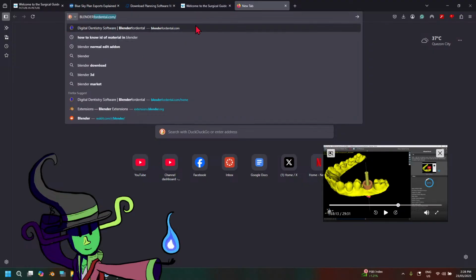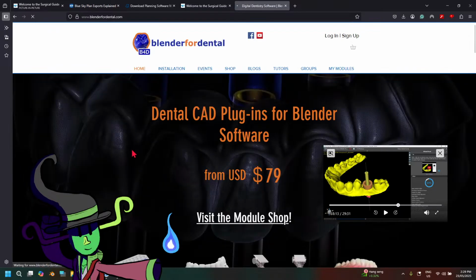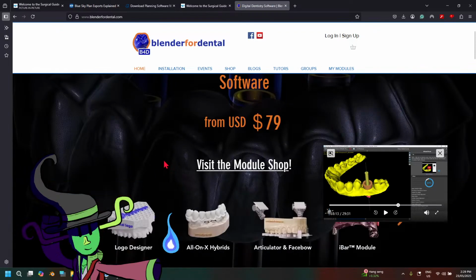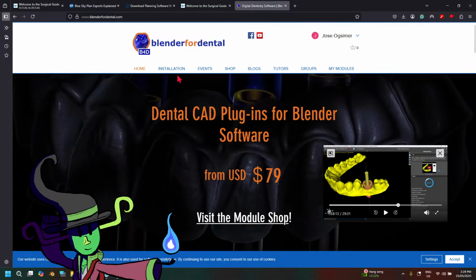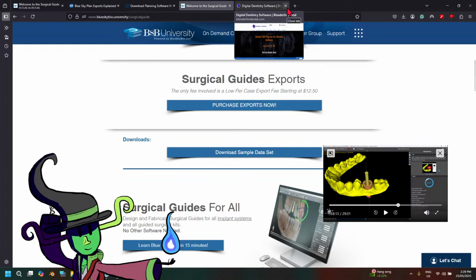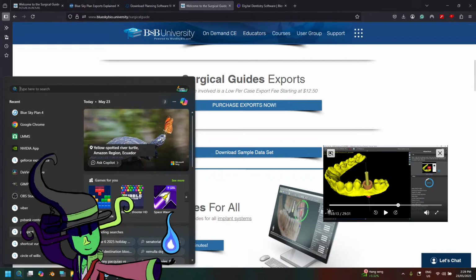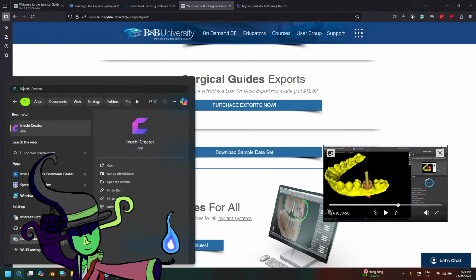Hold on, let me just go to Blender for Dental. I think Blender for Dental to me is a better bang for your buck, because you just need to pay for it once, and it's all good from there. Wait, let me create an incognito window here.